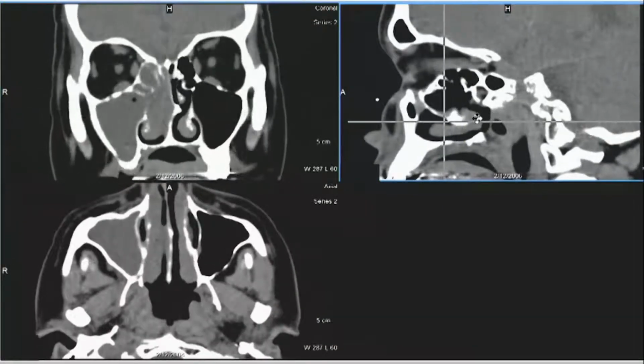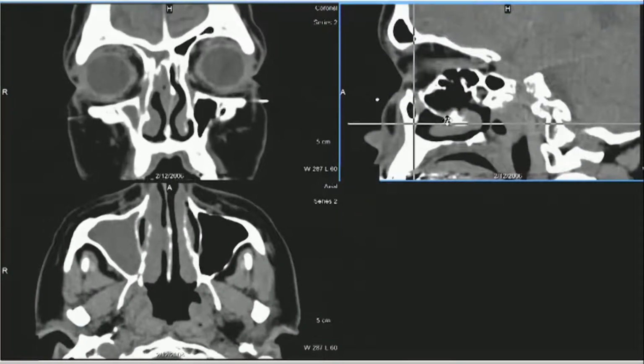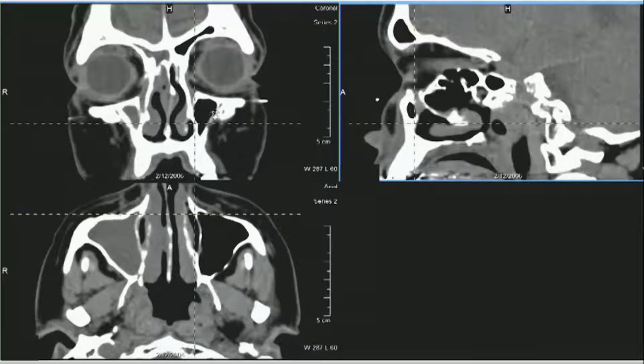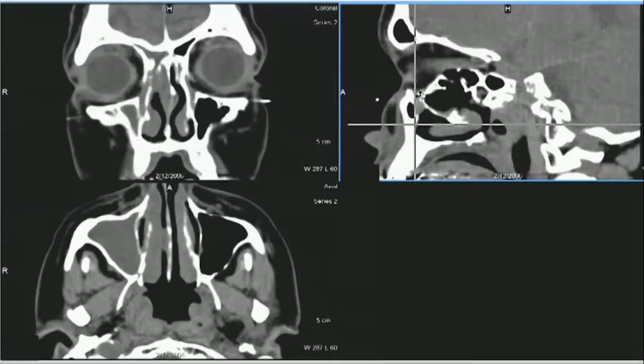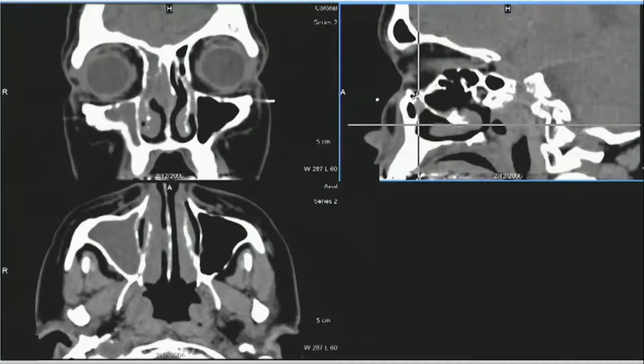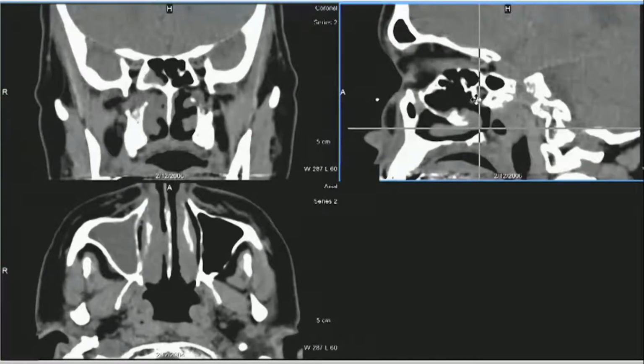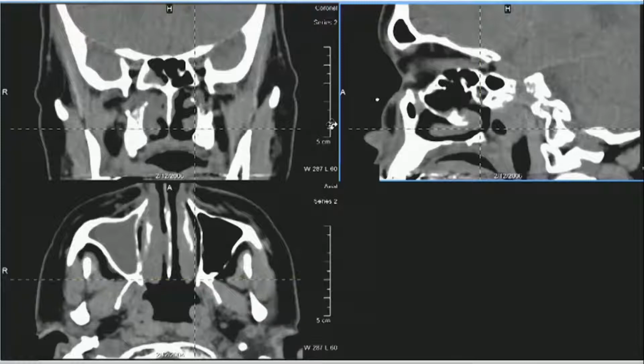We switch to the coronal views then to evaluate the same areas, and we can begin with the area of the lacrimal sac, which appears more prominent on the right side compared to the left. Moving posteriorly, a careful look at the extraconal fat along the orbital floor, which in this patient is clear, and then more posteriorly a confirmatory look at the pterygopalatine fossa on the right, clearly infiltrated on the right compared to the normal fat pad on the left side.